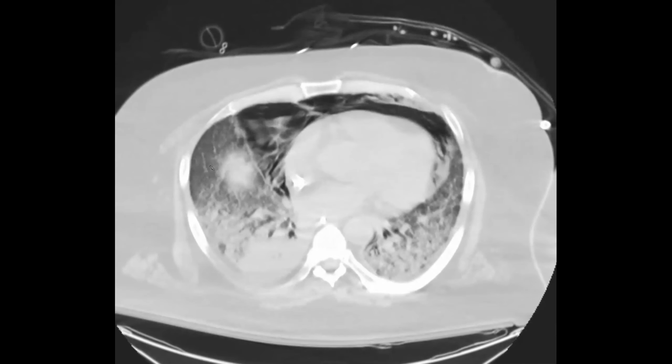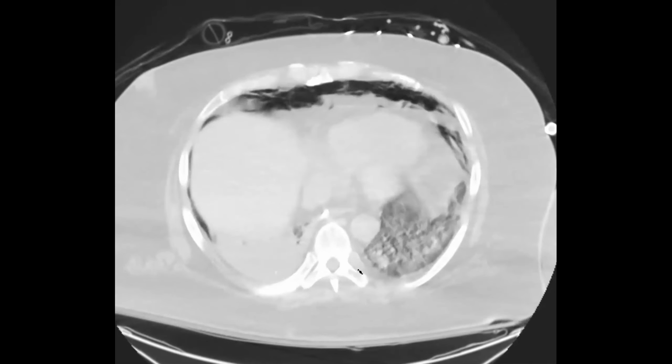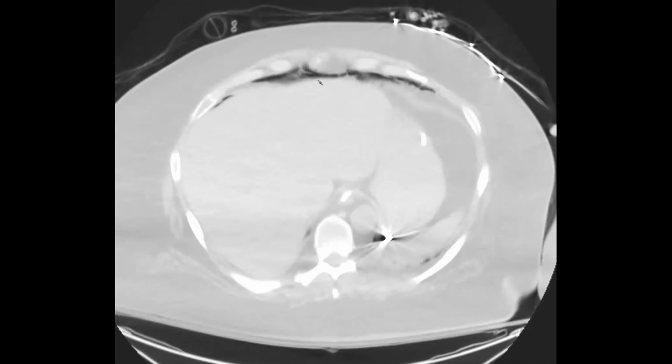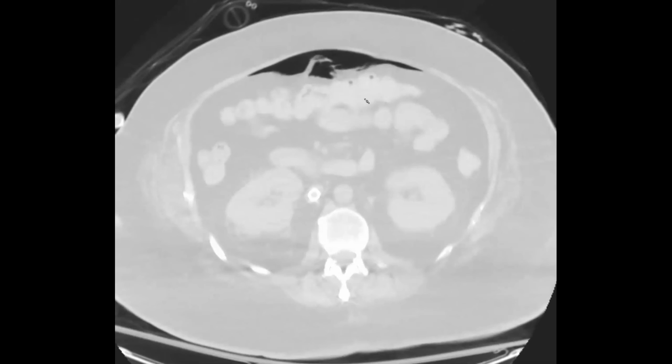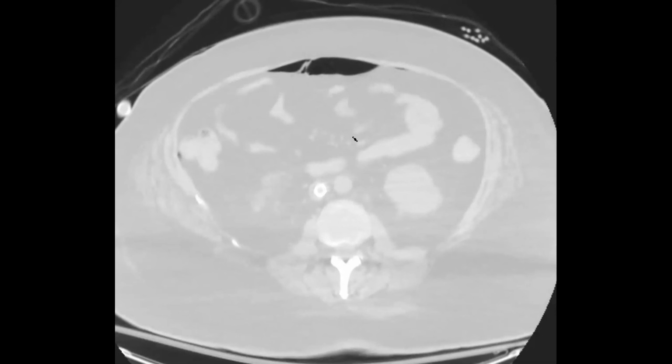Okay. And then this patient, I just have two in a row of this, which I thought was interesting. This patient had COVID. They had barotrauma. They ended up with extensive pneumomediastinum. And then this dissected into their abdomen. And so my resident was asking me, is this free air? Is this intraperitoneal air?